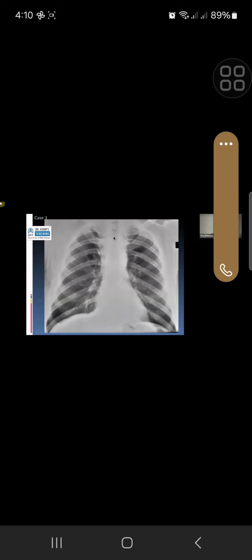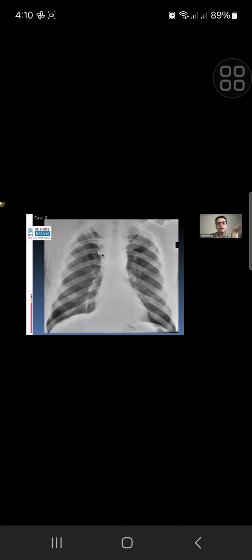If you call it paratracheal, it's not really paratracheal, is it? The trachea is here, and then that's the tracheal carina. It's more below the paratracheal region. So use a term that is a bit more generic and safe. Mediastinal widening, yes, a bit safer. Yeah, that's good. So I'll give you the CT for that.